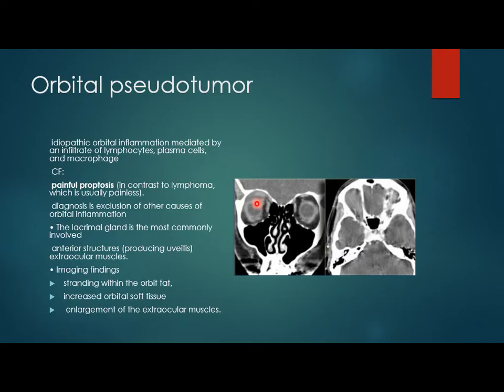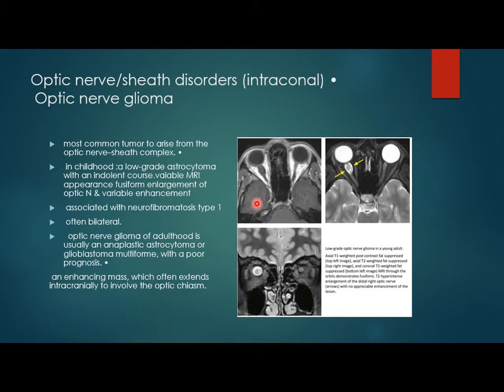extraocular muscles, and it reaches the tendon of the muscle. Yes, it involves the tendon. Yes. Optic nerve sheath disorder, intraconal.